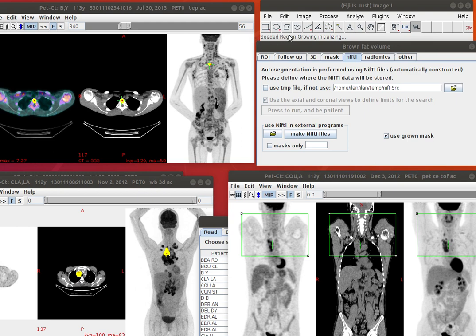Okay, now it's doing the second part of the calculation, the growing of the regions. And when it's done, you will see here how much time it took. And you will see the blue dots here. Here it's coming out. This is the final stage. And here are my blue dots. Let's go back to the ROI.